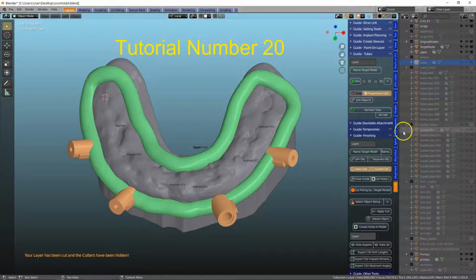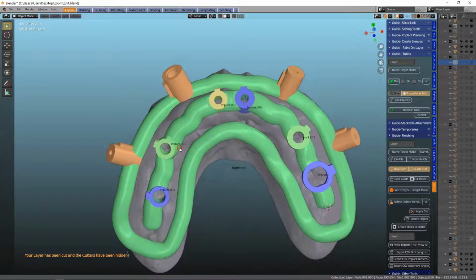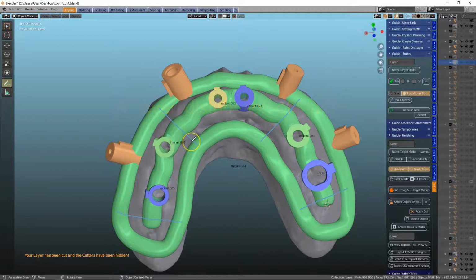I'm going to be hiding the tertiary and exposing the secondary for now. I've got to plan where we're going to put these attachments because they are made up of cross sections going along so that we can connect these up. So say something, we can even go across the implant, so it's quite irrelevant where we put these, but we don't want an overkill of too many attachments going. So this would be a strategic way of doing it.